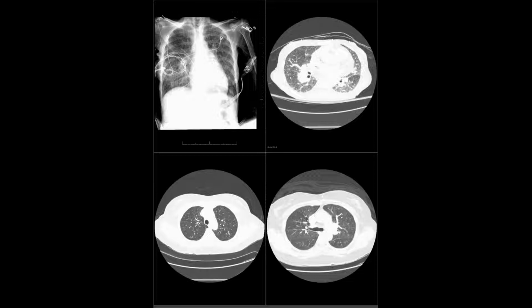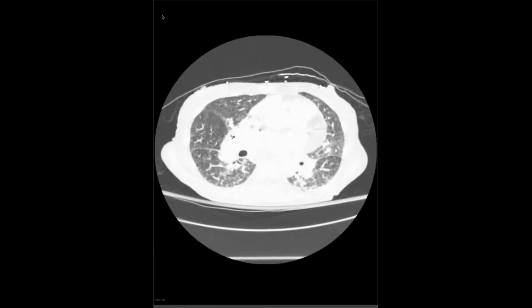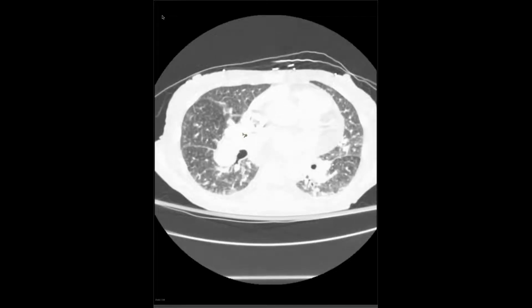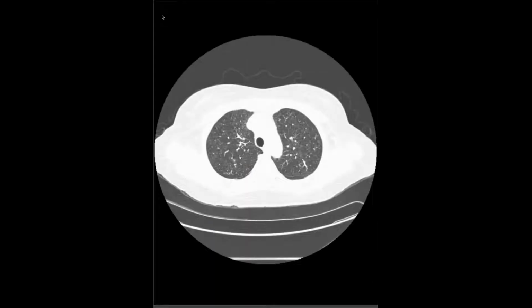It just looks like PAH to me. I mean, it looks like those little centrilobular ground glass nodules you see in PAH. Yeah, that's my opinion. And I think she's in florid edema here. I agree. I think that these well-behaved small ground glass islands in the centers of the lobules are usually just plexiform arteriopathy, and PCH is more florid ground glass stuff in my experience.